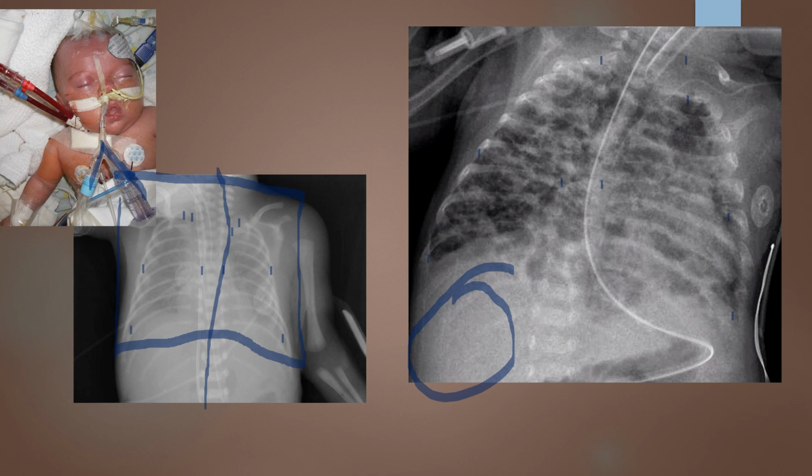This is my patient's left side. So its left SC joint is away from the vertebra. So that would mean that, again, it's in an LPO, which puts the spine into the right lung field, narrowing that. So LPO, I'm going to correct that, straighten the baby's head, correct the mid-coronal plane.